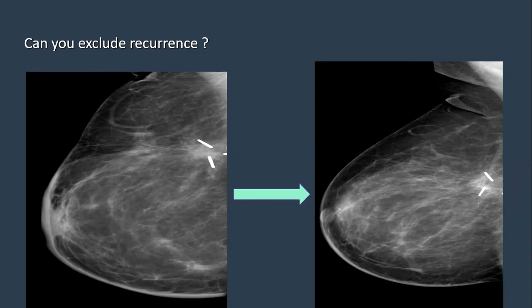So how are you going to use it to manage the patient, to use it as a predictor? Like now, we see these surgical clips. I have to consider them. I am looking for asymmetry at the site of scarring. If the density is increasing, it will be alarming. If the size is increasing, it will be alarming. If there is spacing of the sutures, it will be alarming. So a mass effect is going on. Regarding the calcifications, I am also going to look at whether the calcification is being displaced.